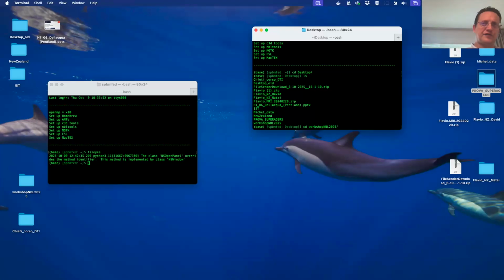After you have done your preprocessing, you have a NIfTI, bval, bvec, and a mask. The preprocessing also gives you a mask. You open StarTrack and you do all your mapping, all your cartography, like anything normal. There is absolutely no difference. And then after you've done this with StarTrack, you open TrackVis and you do your dissection, or you open whatever tools you want to use for the cartography.